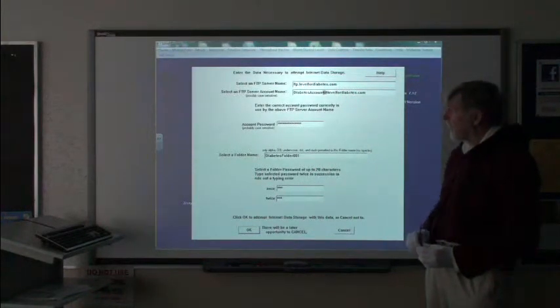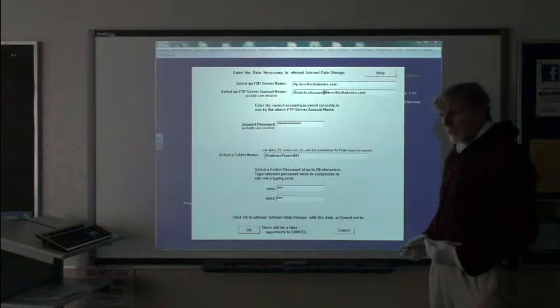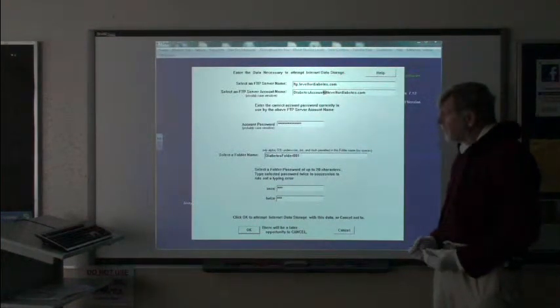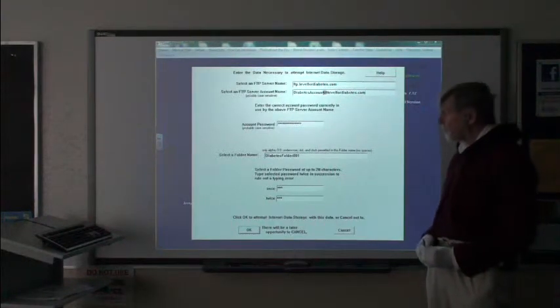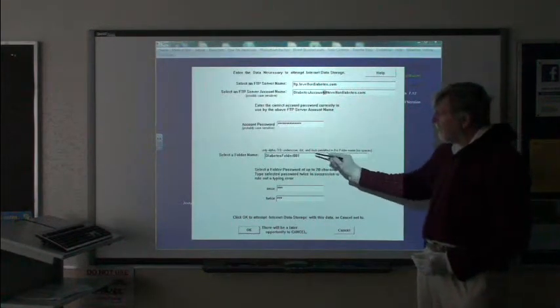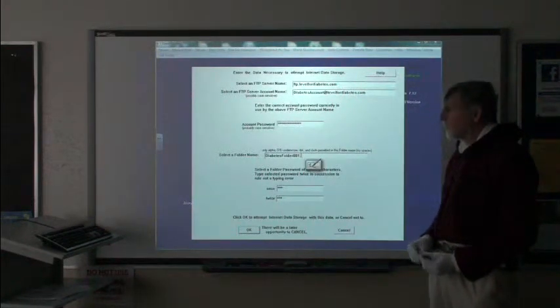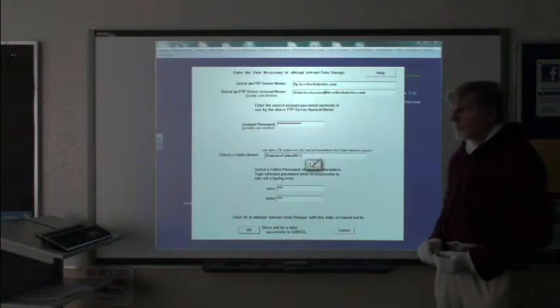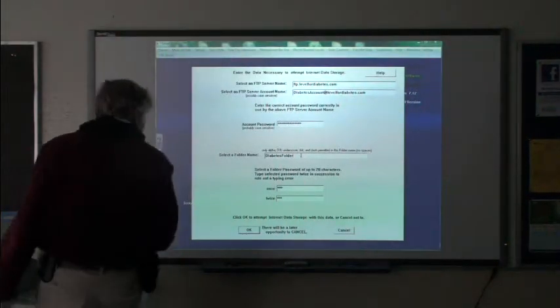Now at this account I can create a diabetes folder 001, but what I'd like to do now, since I am realistically switching to a new physician in this scenario, is to have the diabetes folder assigned to me by my physician. For example, he might already have 122 patients, so he assigns to me diabetes folder 123.